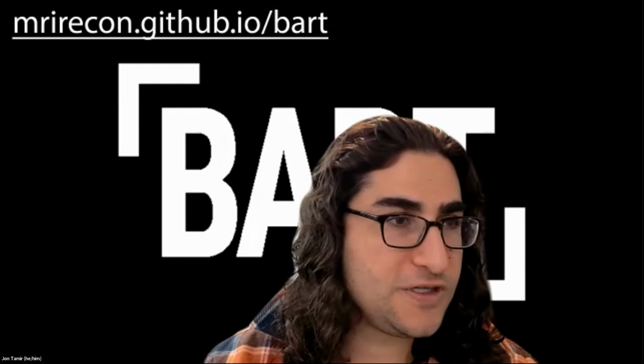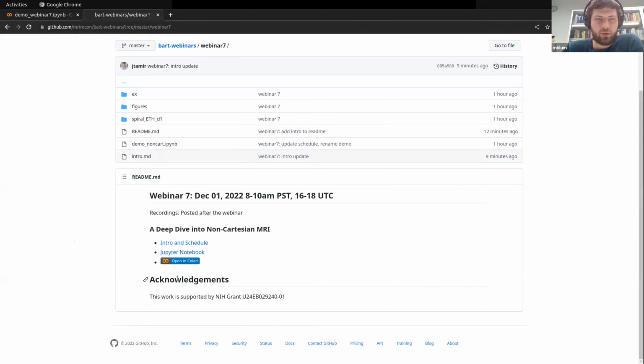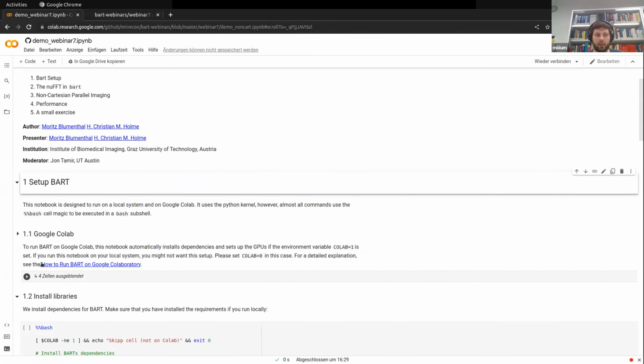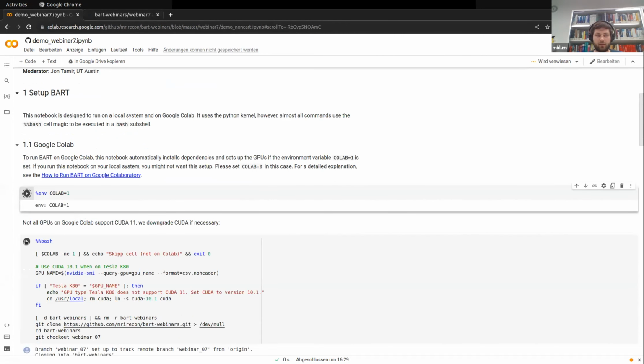All right, Moritz, do you want to get set up? Then I think I take over. Welcome everybody also from my side. As mentioned, we start when I share my screen. From the BART webinar site, you can use this Open in Colab badge to go to Google Colab, but you can also run that notebook locally on your computer. Maybe you already have set up BART, but here we of course need to set up BART on Google Colab, and that will take some time. We go through that by running the setup.